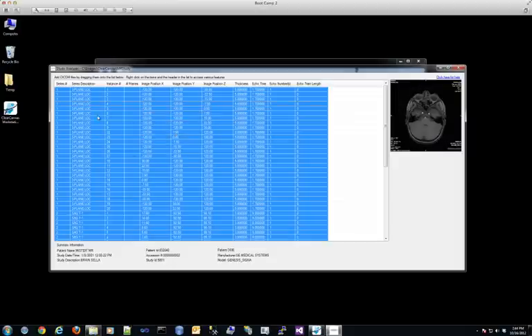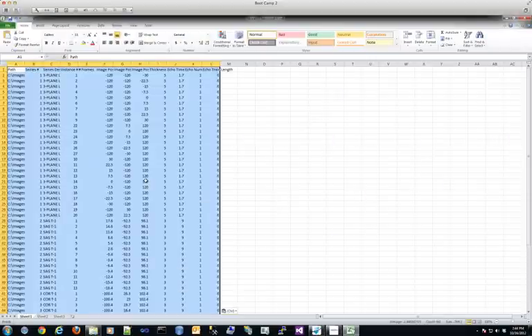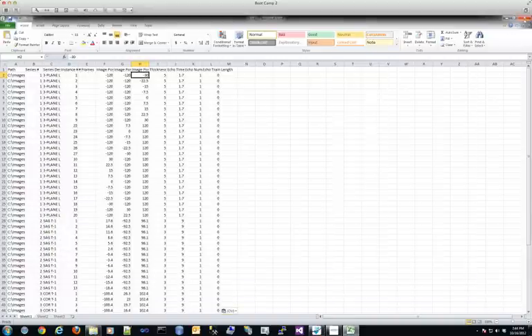And what that does is it copies all these values in this grid control into the Windows clipboard, so it can be loaded into something like Excel for further analysis. So by just pasting the data in here, now I have these values, and I can resort or use Excel's various data analytics tools for charts and graphs to plot this data in different ways. So that's an example of basically extracting select DICOM attributes out of the files and pasting them over in Excel for analysis purposes.